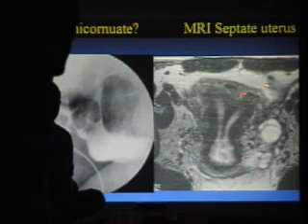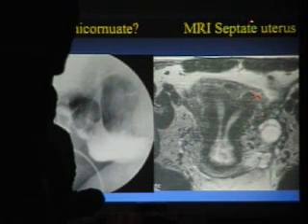We've got a flat outer, basically everything has come together and fused. The angle of divergence of the two canals is extremely narrow. If you like numbers, that should be less than 75 degrees. So that tells you that it's a septate uterus. You're not done at that point.